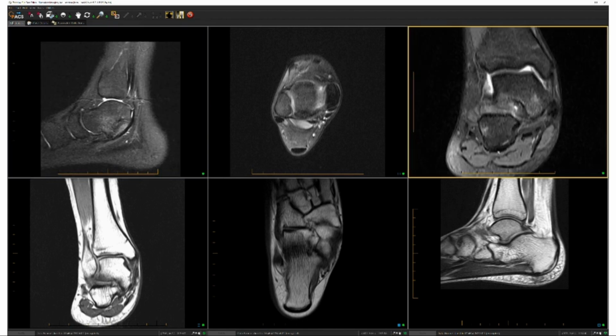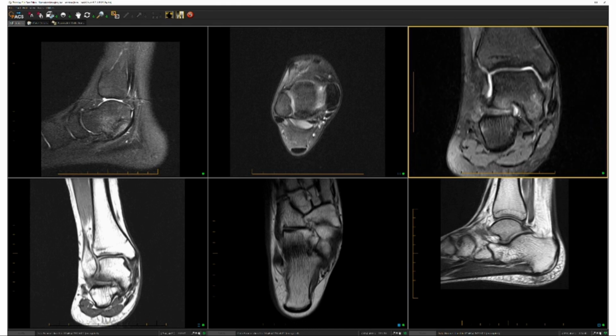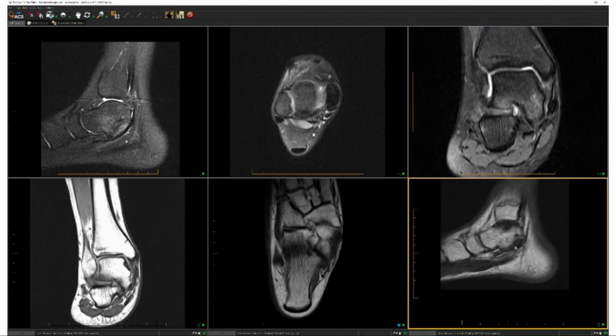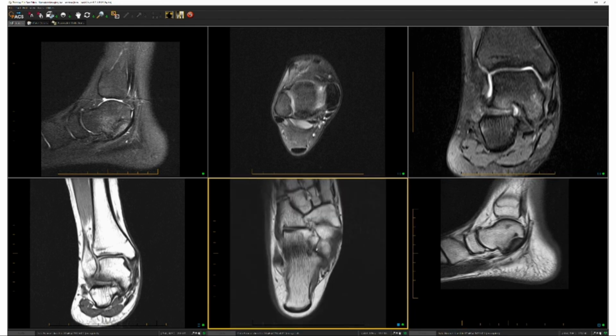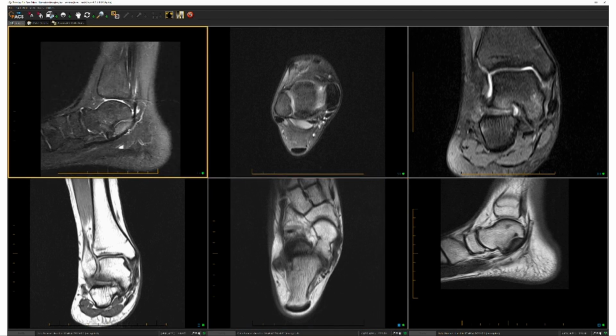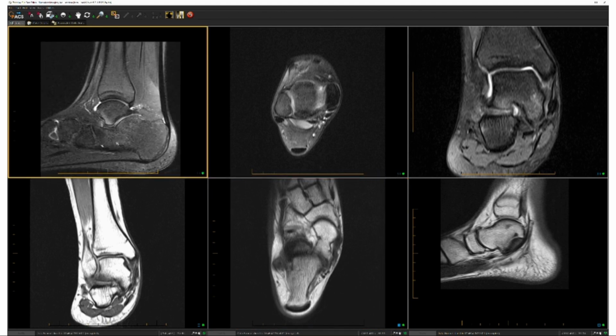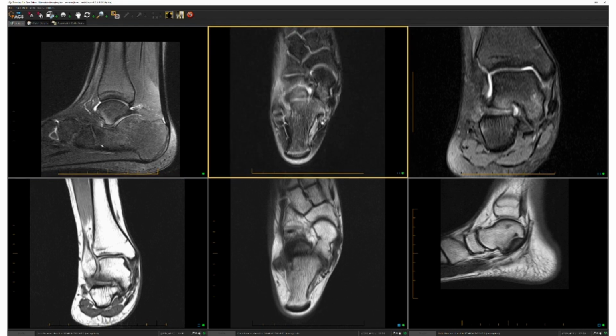The real meat in this case is the bone marrow edema that's occurring throughout the medial talar process, which has an abnormal slope from proximal to distal, lateral to medial. And it has an interdigitation with hypointense T1 changes. You can see here nicely on the axial image in a patient who has this fibrous coalition. The fibrous coalition is likely symptomatic. There's bone marrow edema across the subchondral plate. And there's also evidence that there's bone marrow edema along the lateral calcaneal sidewall.